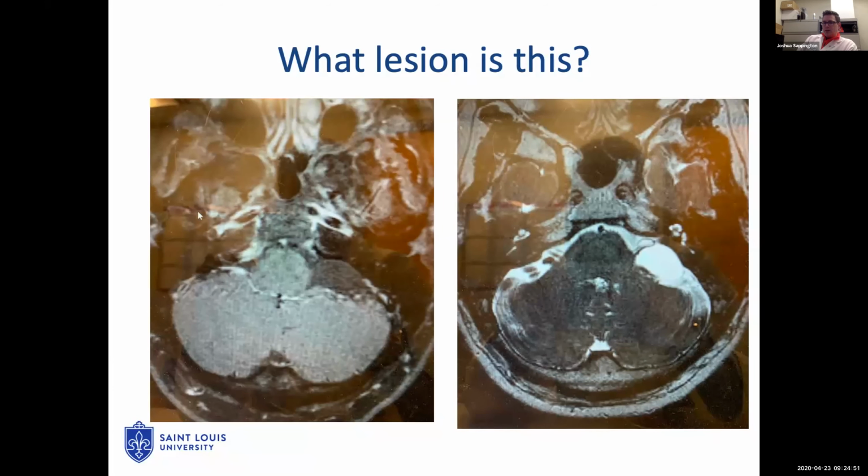So it could be an arachnoid cyst, but you don't know it because unfortunately this patient didn't have a diffusion weighted MRI. Whether that's HASTE, PROPELLER, whatever your institution uses, that's the question you want to know. Because if it does have a DWI sequence, if it's CSF, it's going to look like CSF.